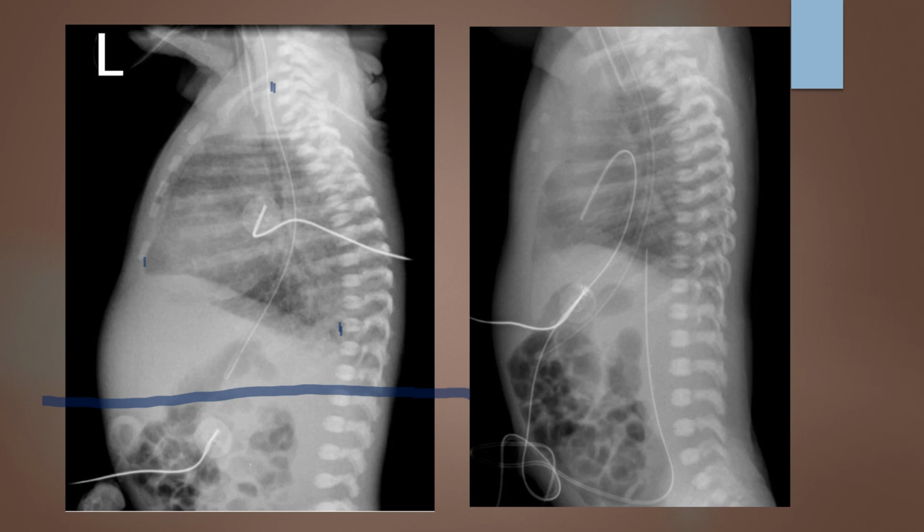Then we're going to look at our technique. So we're looking for soft tissue detail, bony trabecular pattern, and adequate tissue penetration. Our thickest area of tissue is going to be up here in the apex. We see that we are penetrated through that area, so penetration is good. Grayscale is demonstrating lung markings. It's a longer grayscale, so our grayscale is good. But if we look down here, we can almost detect some quantum mottle, as well as up here. So I think it would be prudent to increase or double the mAs.